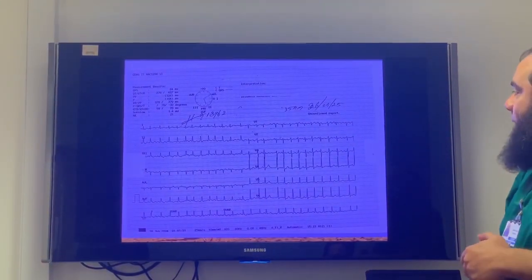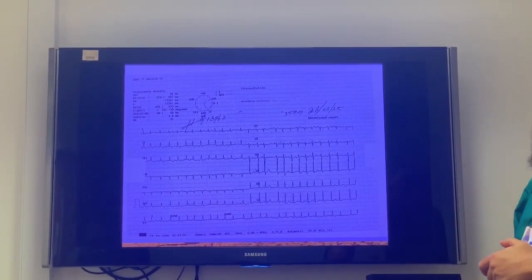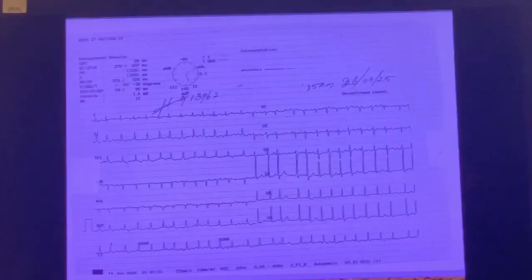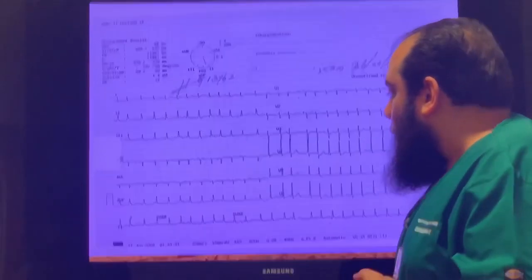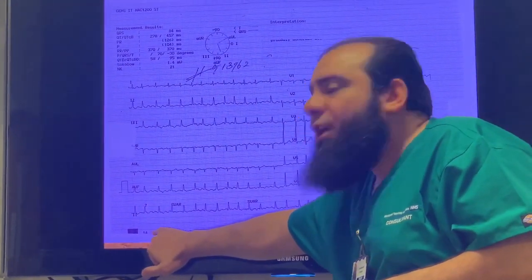Is that a regular one? No, obviously no. So how can we calculate the rate here? We need to mark. Where do you like to start? Here. Why did I choose that? Because one mark here I will not forget.